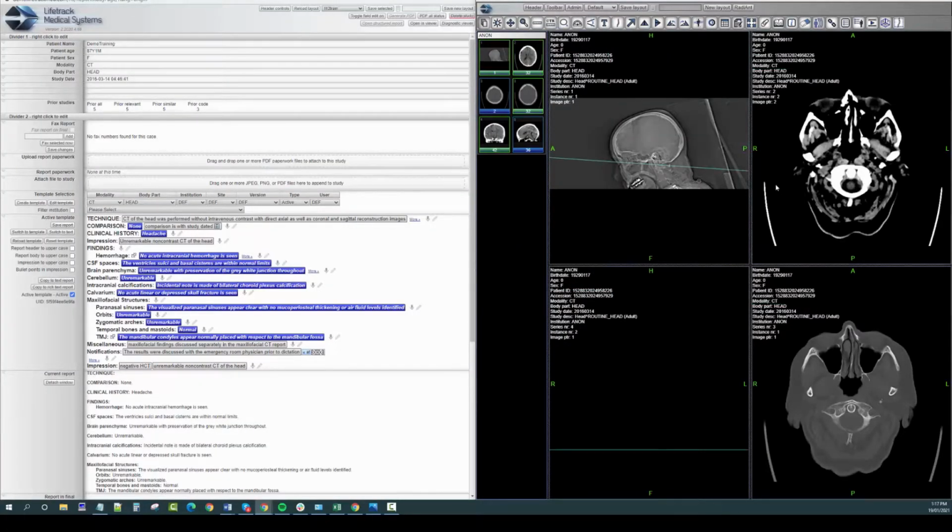You can see here the report page already captures all the pertinent patient information and clinical history of the patient. I don't actually have to retype any of that stuff. That saves me a lot of time and prevents me from inputting any mistakes to the report. Here, you can see LifeSys Active Templates, which is an advanced structured report writing feature built in and included in our platform. This intelligent feature can capture the clinical information shared by the technologist. I have the option of including that into the report just by clicking on this.